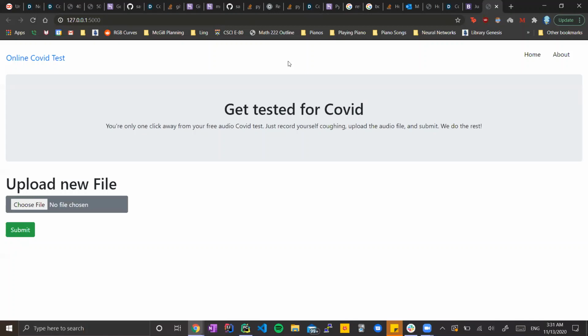So, our web app allows a user to upload an audio file containing the sounds of their coughing. It can be either a forced cough or one that's caused by a respiratory illness that comes more naturally, up to our website. And upon pressing the submit button, the audio file is processed, padded, and inserted into our trained model, which then predicts the likeliness that the audio file contains coughing caused by COVID-19. This information is then displayed for the user to see.